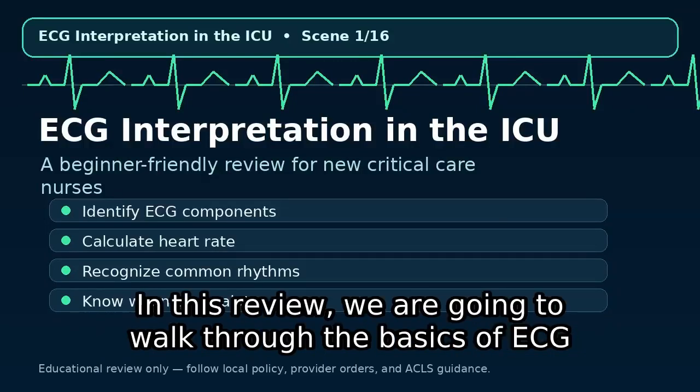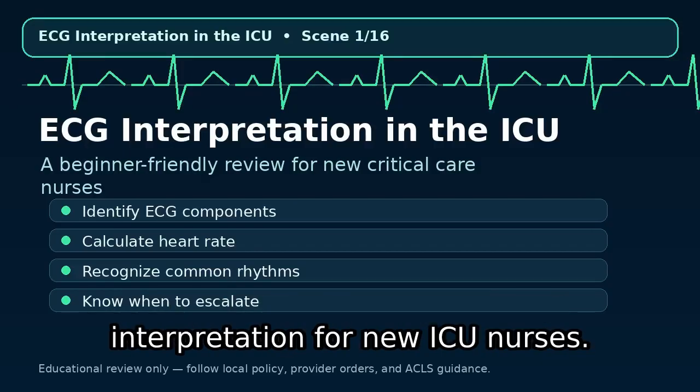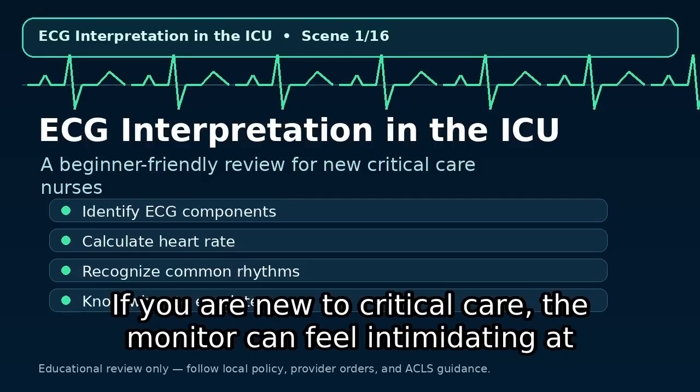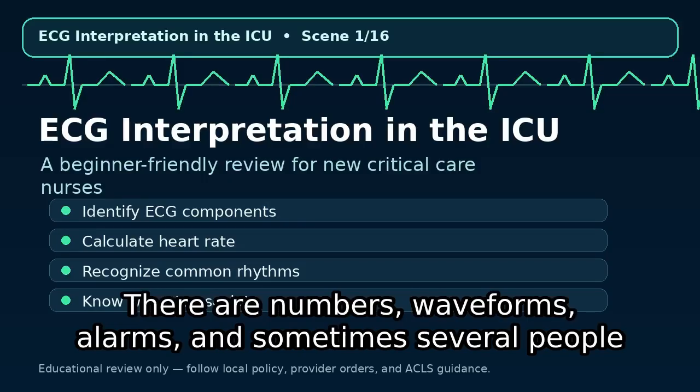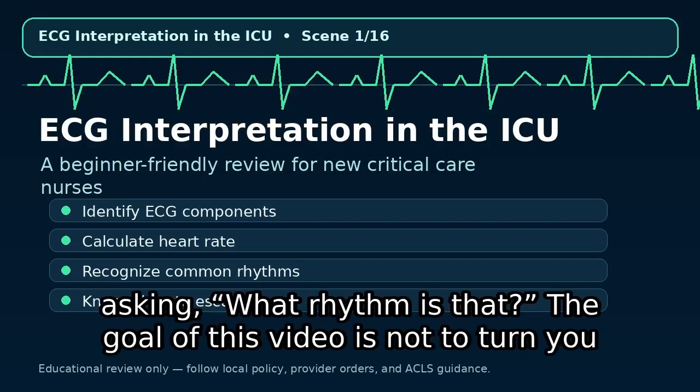In this review, we are going to walk through the basics of ECG interpretation for new ICU nurses. If you are new to critical care, the monitor can feel intimidating at first. There are numbers, waveforms, alarms, and sometimes several people asking, "What rhythm is that?"